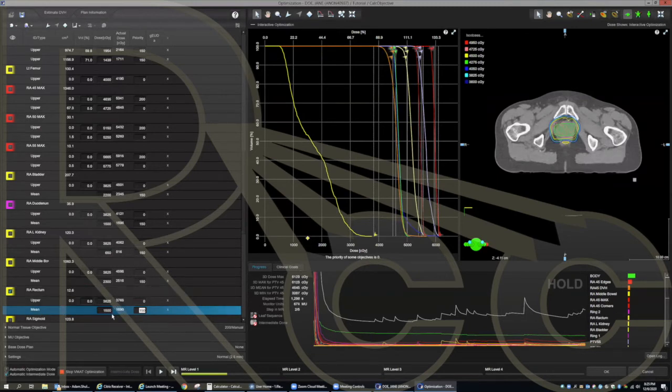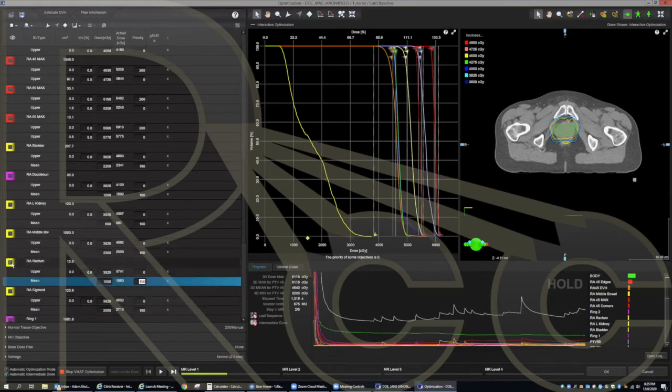And we're visualizing these dose differences here. And again, if you don't have this value to visualize, you can't do it with mean, but you can actually look at your DVH and get an idea where things are. You can put upper limits and actually look at your DVH if your planning system doesn't show you actual values. So there are multiple ways to achieve things.